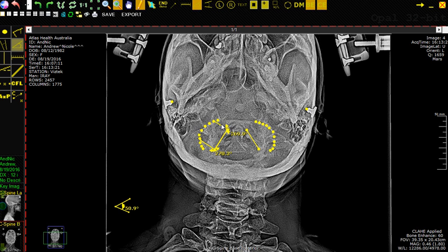What we need to do next is determine the midpoint distance between this anterior line 1 and this posterior line 1. We can use the central point tool, but how handy would it be if it's already pre-calculated? We click on the spot of anterior point 1, and then we click on anterior point 2, and it makes this nice little X, marking the spot for us. Then we do it on the back side, from posterior point 1 out to posterior point 2, and same thing, it's created a lovely little X here.